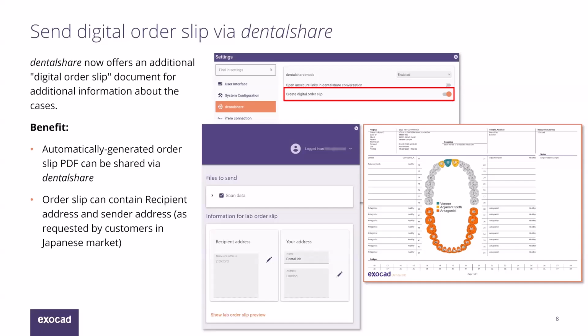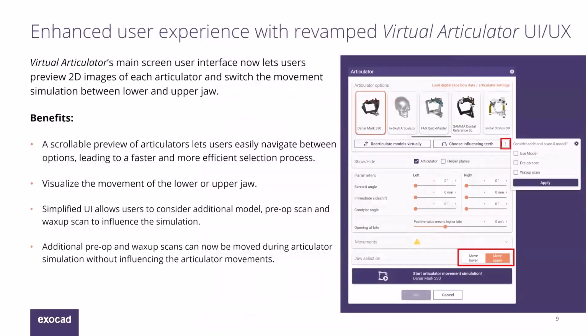So everything is right away set up with the color, the shade, if it's a healthy tooth, with the color, with the material, and so on and so on. Everything to make your workflow fully digital, with a better experience for doctors and the labs. So then an enhanced user experience.